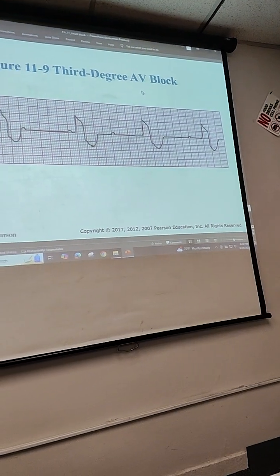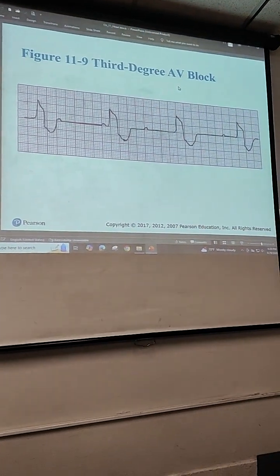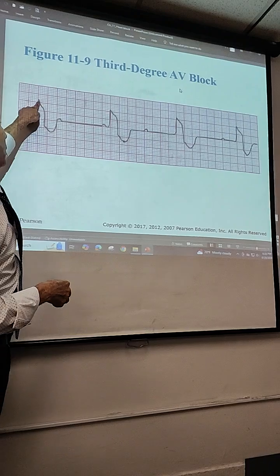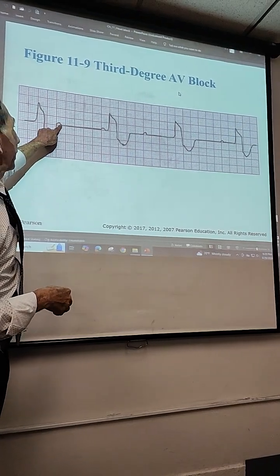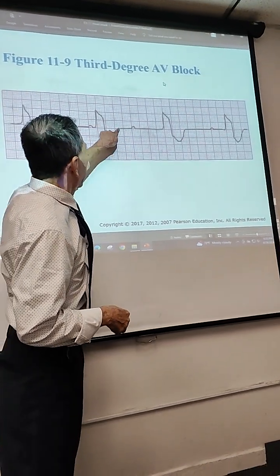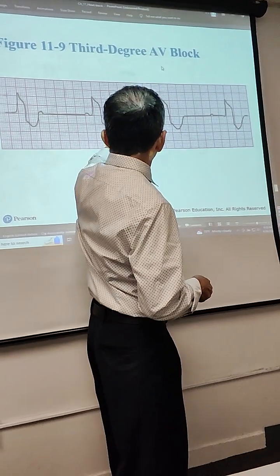Here it is. This is a real one. This is the QRST. P, drop, P, again, Q, R, S, T, P, see?